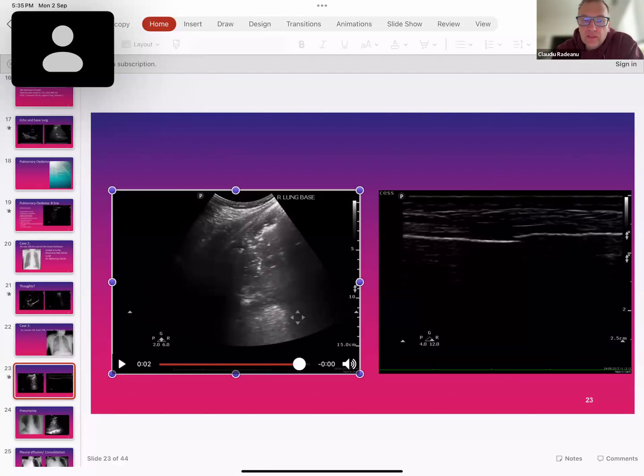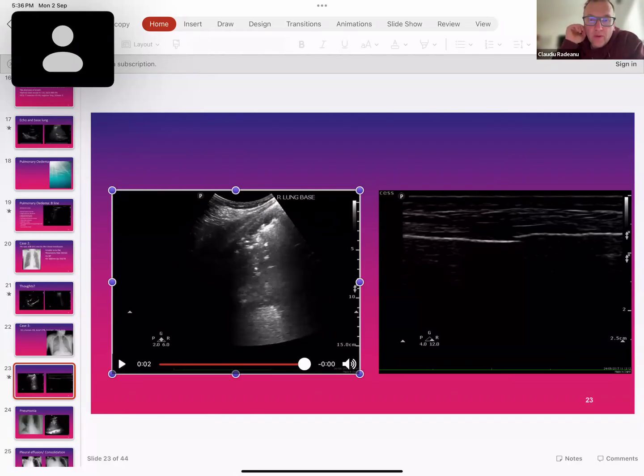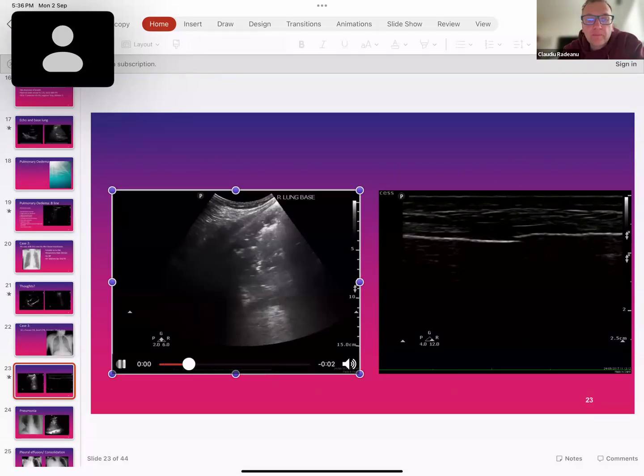In this area, you have the diaphragm and the liver. This is lung. Coming back, this is completely different from the image of the normal ultrasound. So I would say that is abnormal lung. Anyone wants to have a go? What might it be, given the scenario?